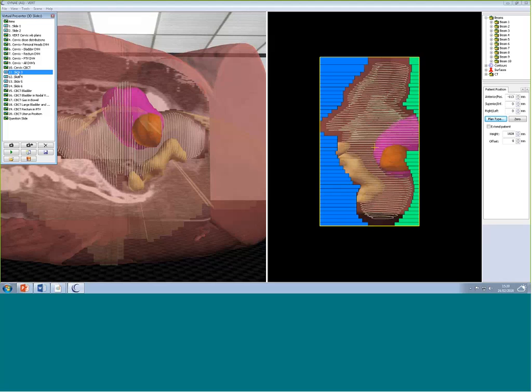Tom, I don't know if that one worked. I think so. You can see the jaws moving slightly there. Yeah, it's much clearer on Vert. You can see the real difference in the movement. What we were trying to demonstrate is, when you have a movement and you make a call, if you have a difference of 0.5 or 1 centimeter, what it does to the volume and to the organs at risk. Bearing in mind, it is an IMRT plan, and of course the image does not look like this because it's moving, you would have to explain what that does to the patient and the organs at risk, and base that to aid your discussions around any problem-solving issues you have.